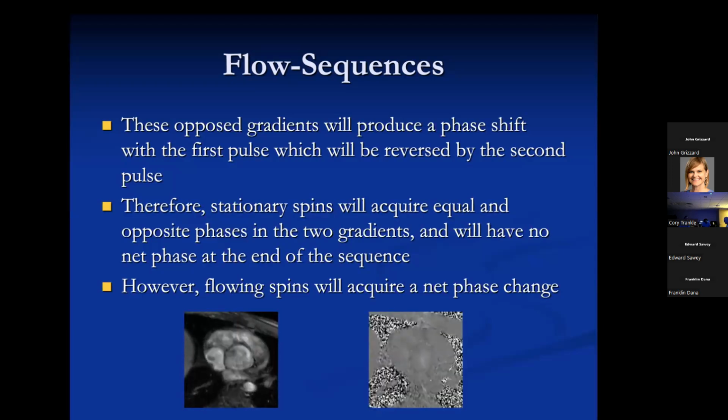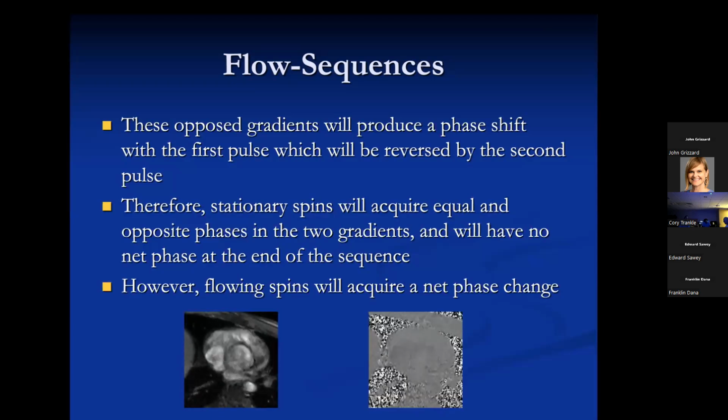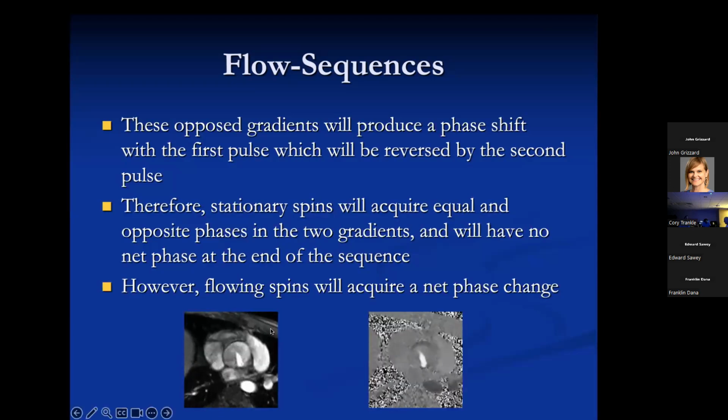This is kind of an interesting eye test for anybody who's looking at that. It kind of looks like a bicuspid valve, but actually it's a unicuspid valve, and I just throw that in for fun. You can tell that because it doesn't go all the way from wall to wall. It just goes about halfway.